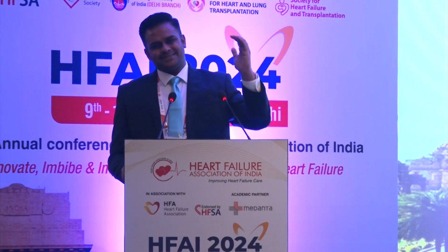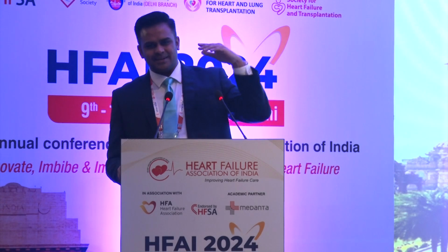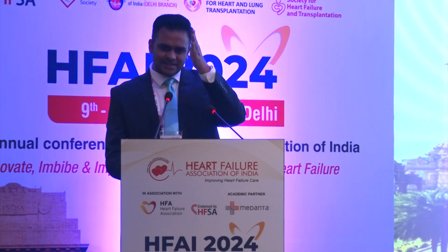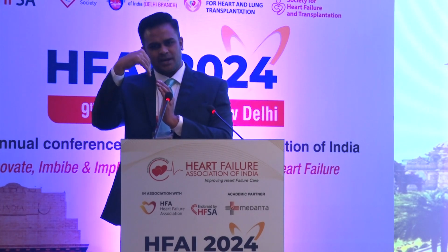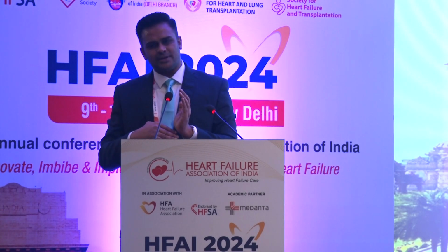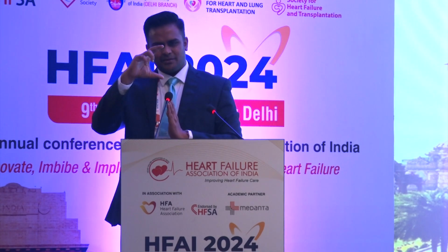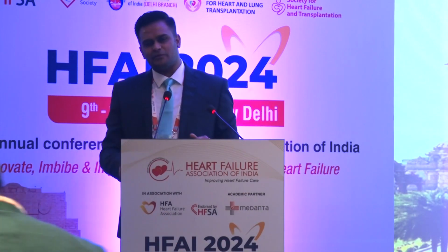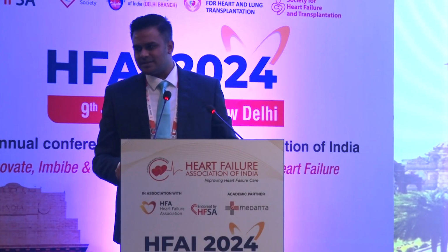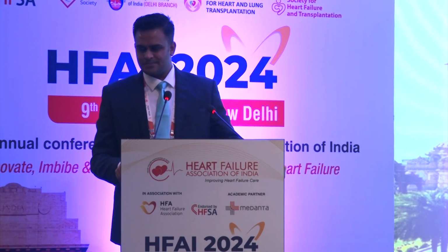You can assume that the upper part of the aortic arch forms the first line, and the second is where you see the notch, a change in contour at the point where the SVC joins into the RA. The third point will be the right cardiophrenic angle. So this is the entire distance, half. If the RA comes up above that, you will say that it is more than half of the right heart border.